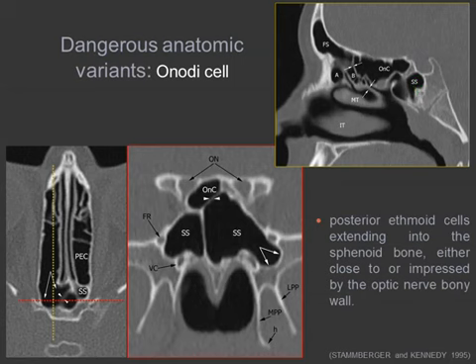Because if you are a surgeon and you have your endoscope moving in this direction, and you don't know that this is the specific arrangement of that patient, you run a very large risk of thinking that you are going to reach the sphenoid sinus. Instead, you are so close to the floor of the anterior skull base. Therefore, you really run the risk of damaging the patient.